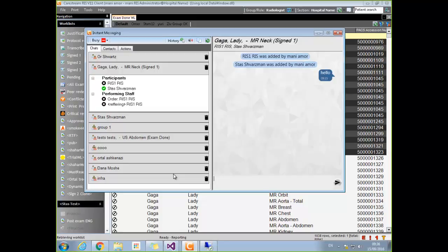You know what might be good to put up there is the patient banner. Sorry? The patient banner. Yeah, that would solve everything, if it fits into that space. I don't think that we can do that, but we can create our own banner control for us. We need flexibility. If you add more, we need to. Yeah, I'll definitely make a note of that.